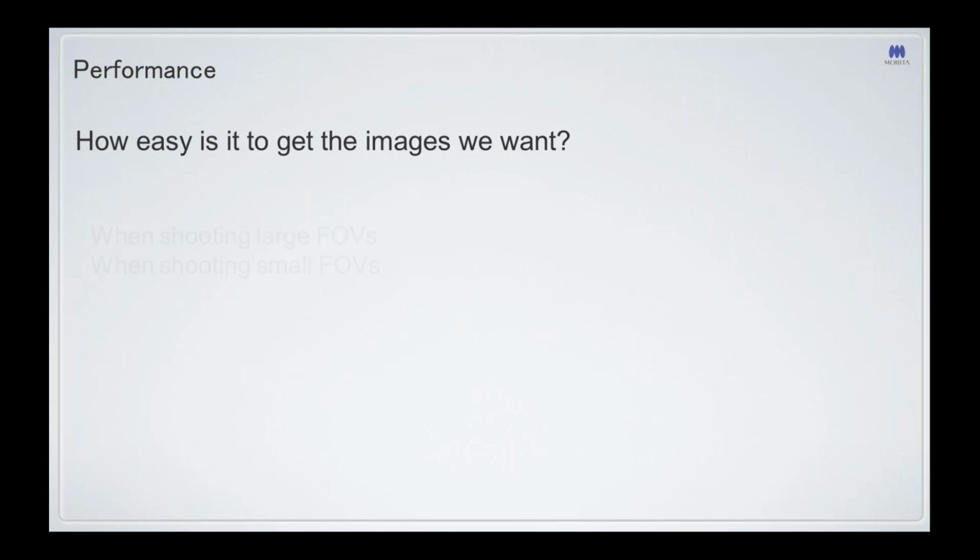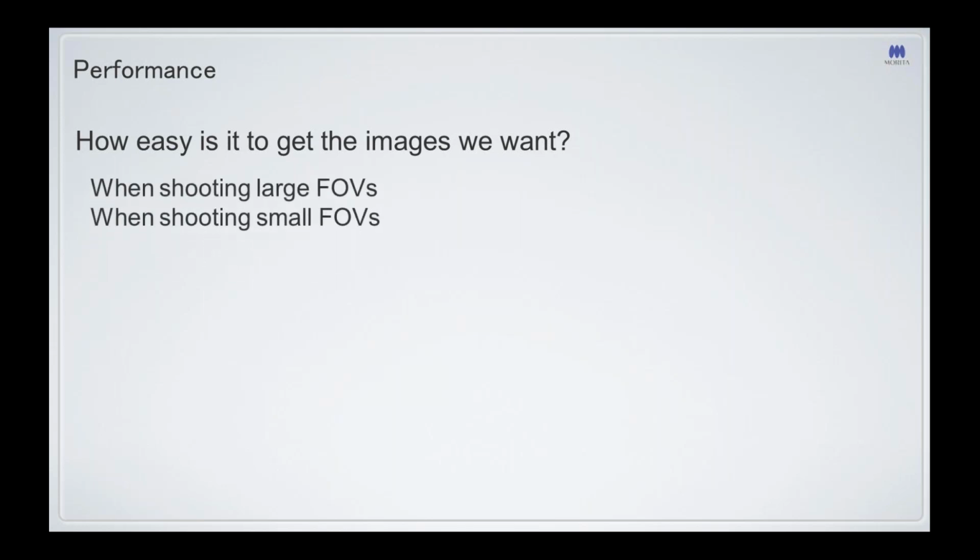There's no point in buying an expensive machine if it's difficult to use and your staff are unable to position the patient consistently. So when you're shooting large and small FOVs, do you have capabilities within the machine to make that job easier?